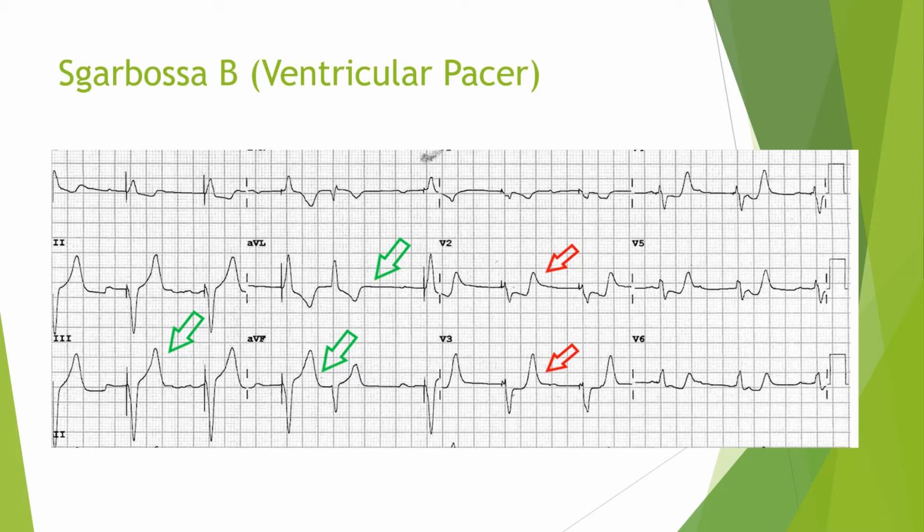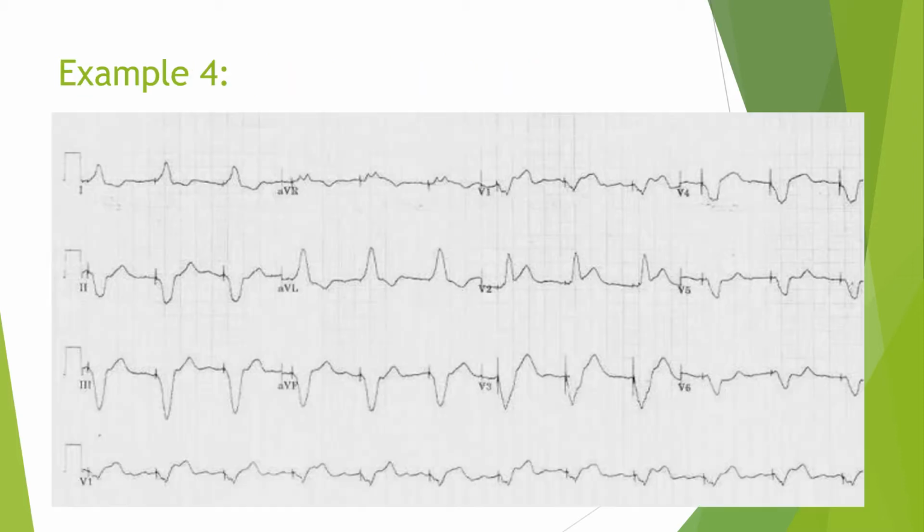This person also had a 100% LAD, and had we not applied this, it could have gone missed simply because the patient has an implanted pacemaker. Here's another example. This is another ventricular pacer rhythm. You can see it with the dashes there before the QRS complexes.